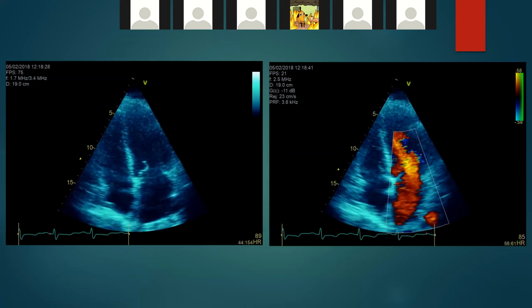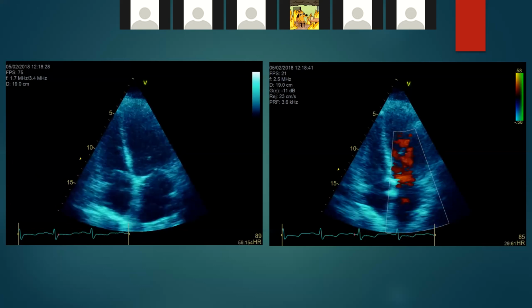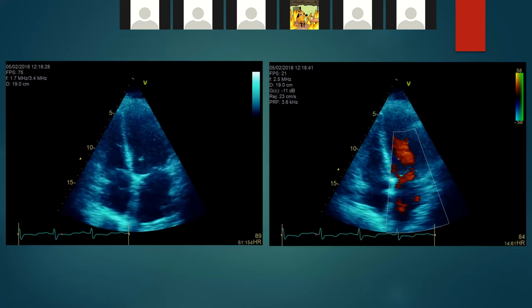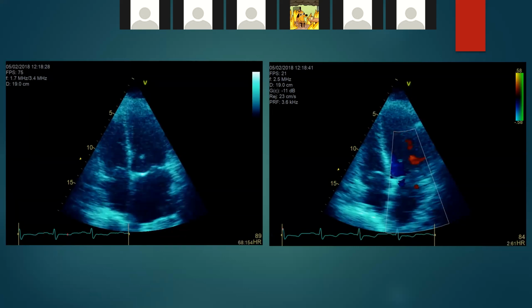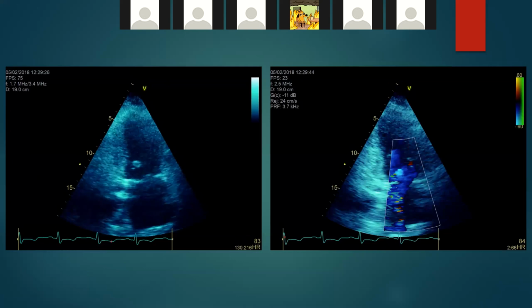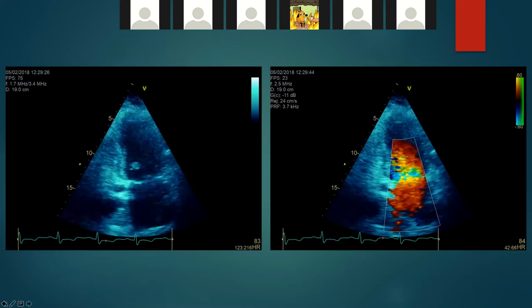Very nice. And sorry, the last thing, Jamal, do you want to remind us about the scallops? Because that's what I'm asking everyone now. I'm loving it. Okay, I'll pass the caveat, the transthoracic is not usually what I do. But if this is an apical 4, I guess it would be A2, A3 over on the left and P1 on the right of the screen. Yep.